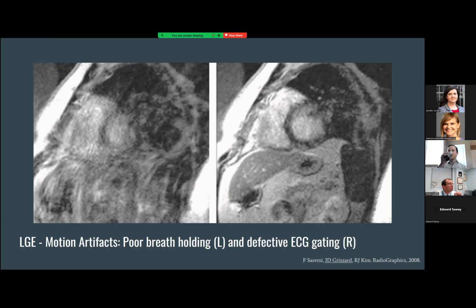So you're filling K-space at a quicker rate and not just getting fewer lines of K-space there. And of course, we have our single shot images where we're trading off breath hold time versus our spatial resolution, but better to have that than a non-diagnostic scan.